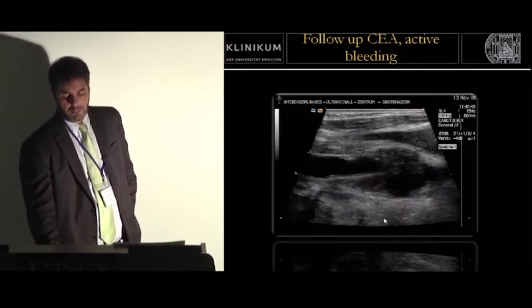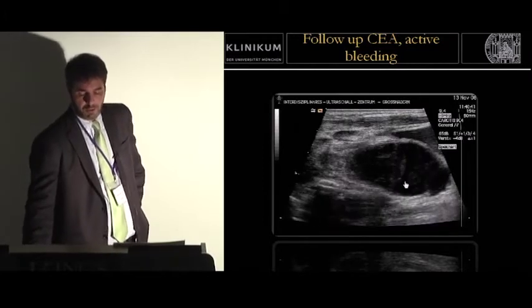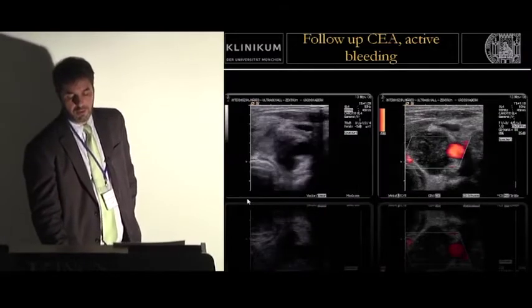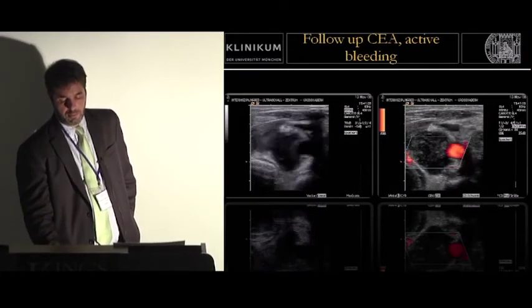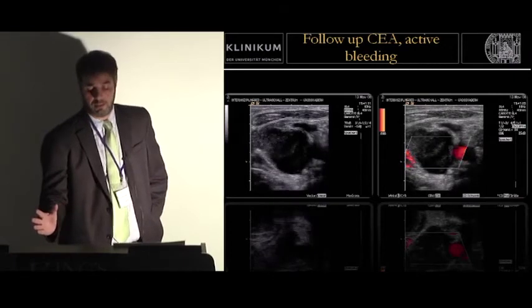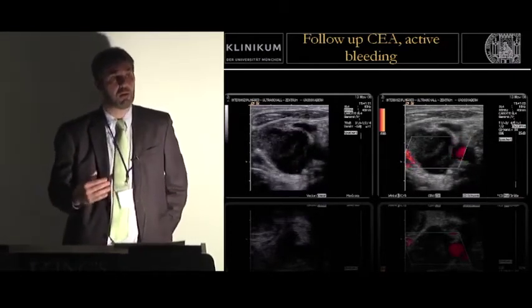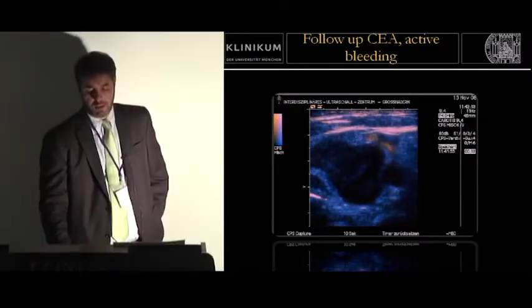On the other side, there also could be complications like hematoma. And the question is, is this a hematoma which has an active bleeding, yes or no? Therefore, we just look again in the axial plane. We see just adjacent to the carotid artery a hematoma. And probably it's very difficult to rule out by using the Doppler to say that this hematoma doesn't show any contrast uptake.